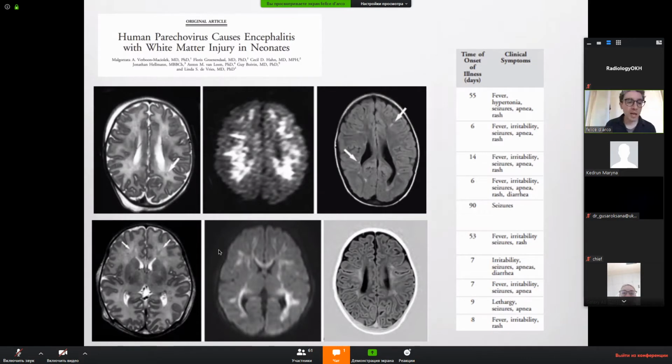It's not the only one, but look, in T2 it's very difficult to see. You can have some areas of hypointensity along the deep medullary vein distribution, almost looking like the deep medullary vein engorgement pattern with punctate white matter lesions I showed you last time, because the areas that are involved are the same. But the diffusion is striking, is much wider, and you have this tear-like abnormality. They are shaped like a tear in the face, at least as I like to describe it.